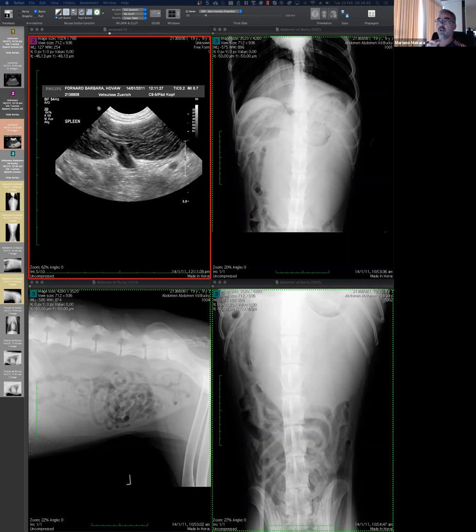When there is a GDV, usually the dorsal part of the spleen goes ventral, and we talked about that. There is a characteristic appearance of the spleen in cases of gastric torsion. But what I was referring to is the whole displacement of the stomach. So I think in this case, it's going to be kind of a stretching of that ligament.